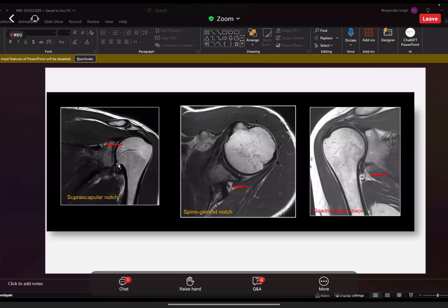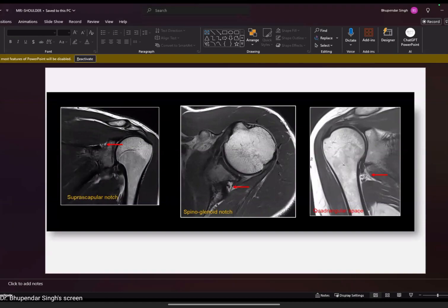There is the humeral attachment of the ligament here, and here is the glenoid attachment of the inferior glenohumeral ligament. So whenever there is avulsion or any injury at the humeral attachment, we call it humeral avulsion of the glenohumeral ligament. Basically, it's an inferior glenohumeral ligament injury, either HAGL or GAGL, depending on which part. If it's a glenoid attachment injury, I showed one case, right?